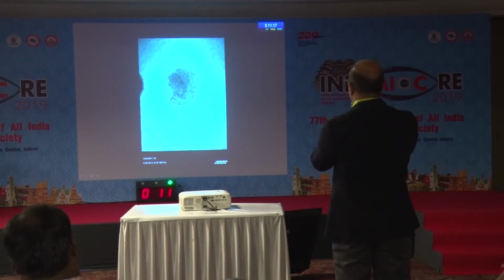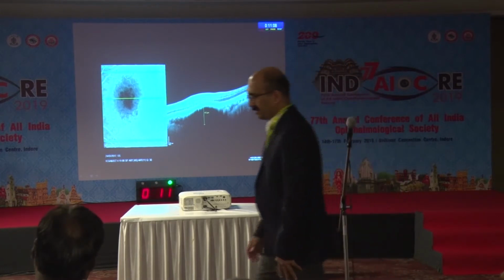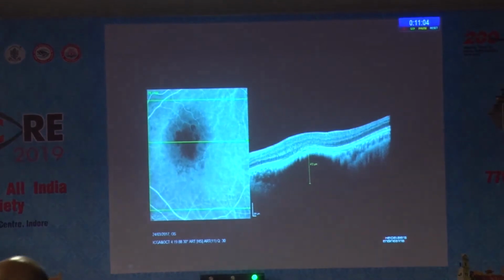Okay. So it's very unfair to surprise a person with an ICG, but that was pretty well said. And probably nowadays you think that you don't need anything else, you need only the OCT. So this was the OCT picture. So can Dr. Anand comment?